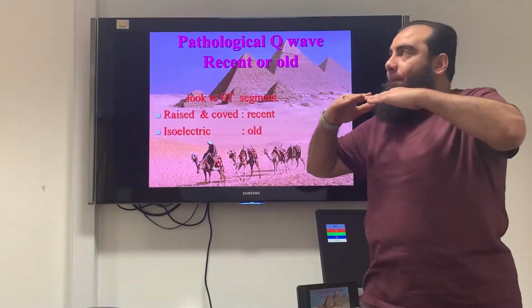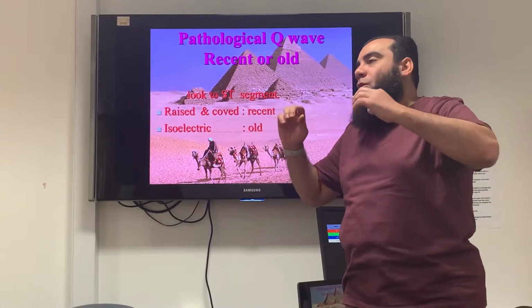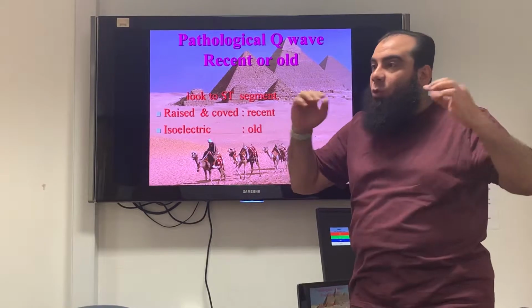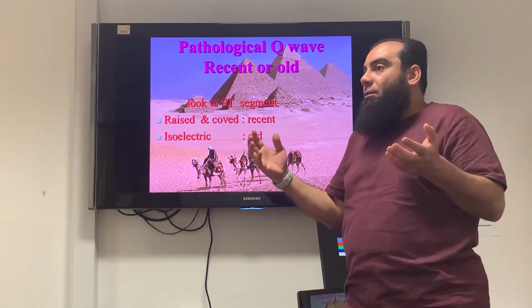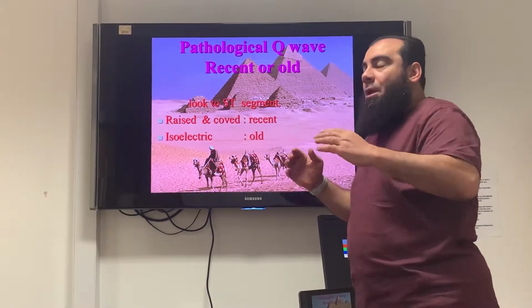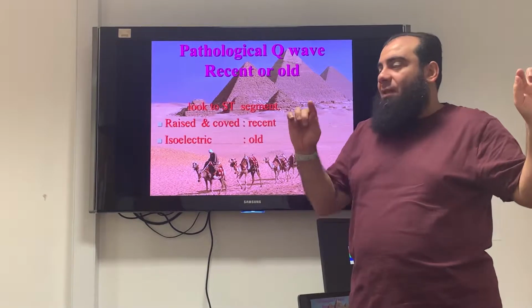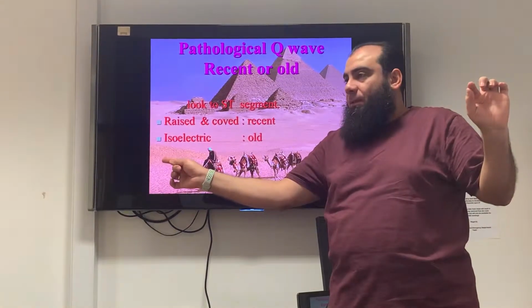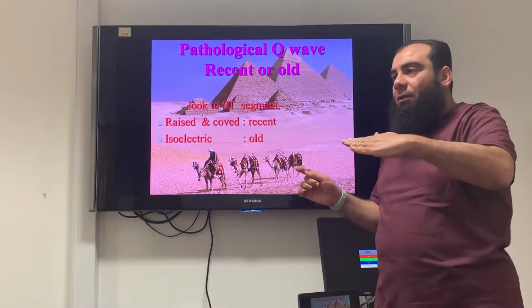That's fine, but we cannot just leave it imagined, because we need to draw it truly. Then we can compare, otherwise it will be a matter of personal variation. I can imagine it here, you can imagine it elsewhere. So it is the line between the previous T wave and the coming P wave of the next beat. So the TP segment is isoelectrical.